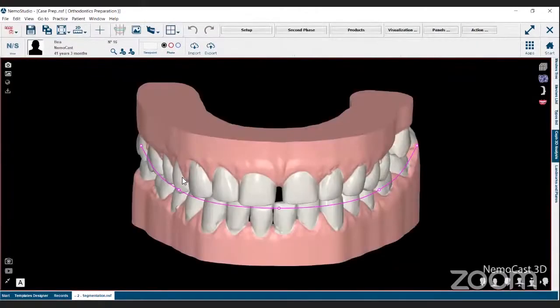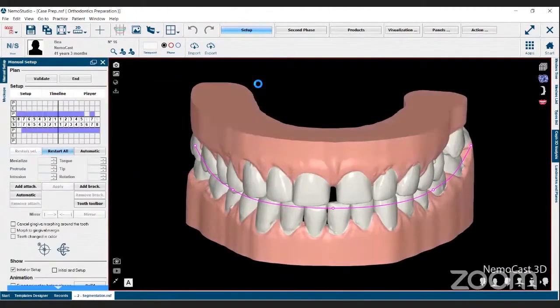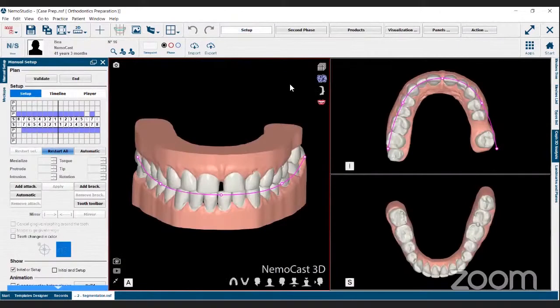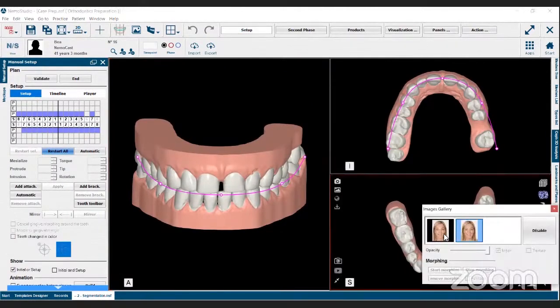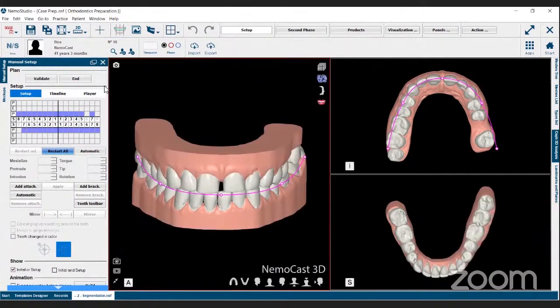Now, this is very interesting because the software has many tools to cover different specifics, because as you can see, the relationship of our bite is not the same relationship as in our photo. We can't see that here because in both photos I already did the mask first, but I'm going to bring in another photo.